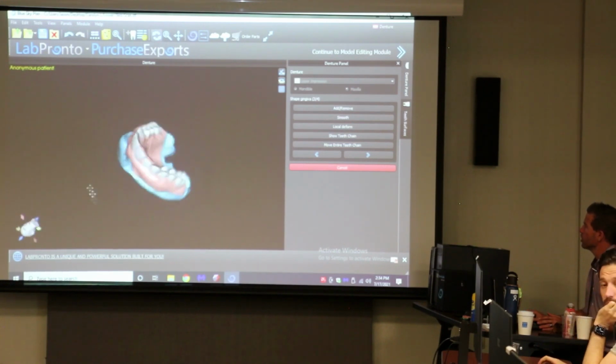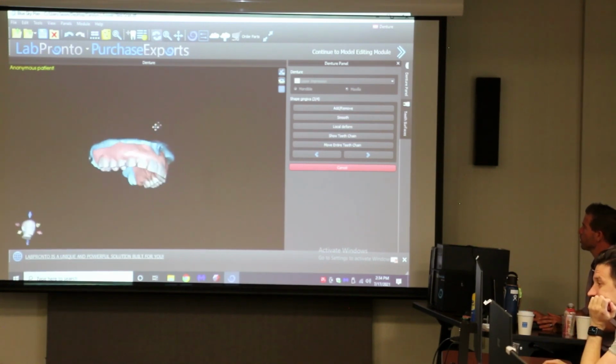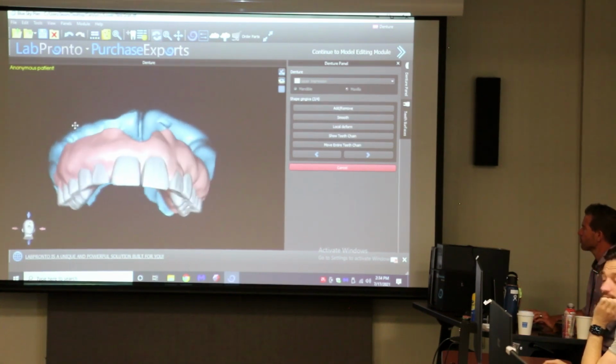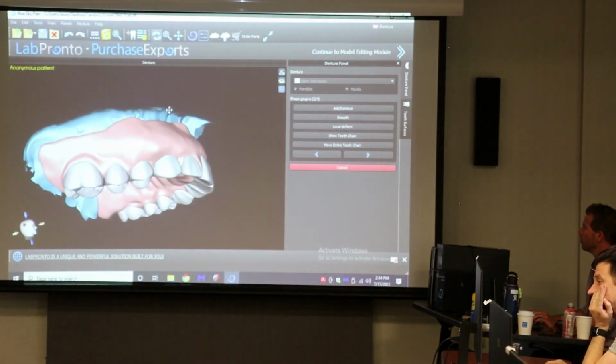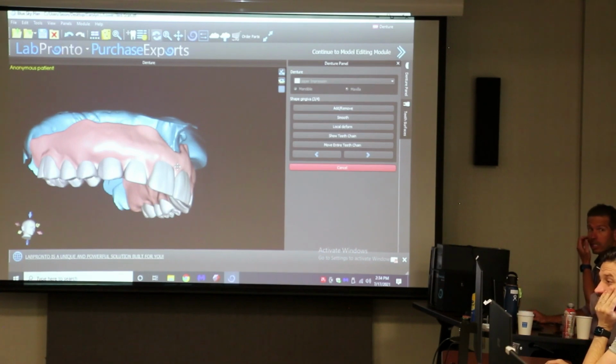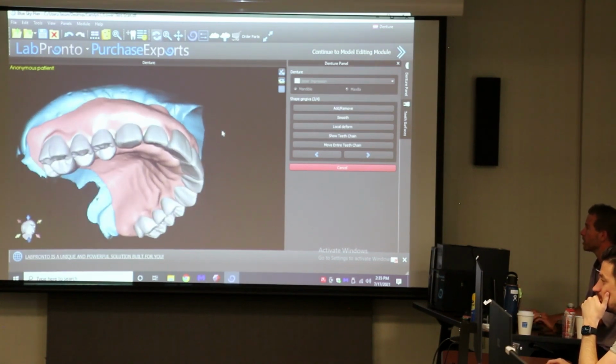Okay, so has everybody got a denture? Still thinking. And you can see how, when you don't reduce a lot of the jaw, and the patient had teeth and you just deleted the teeth and there wasn't any reduction or resorption, you get thick, bulky interims, right? Kind of like what we're used to. Interims are just thick and bulky because they've got to go outside of the existing bony housing, essentially.